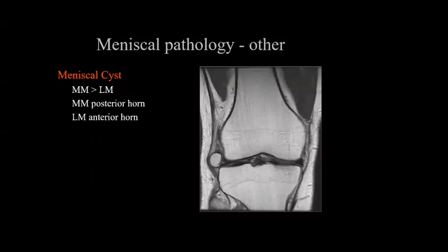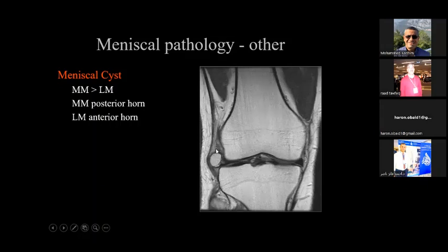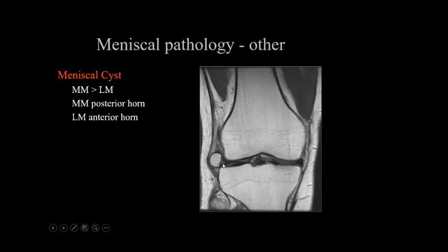The other thing we need to comment on, and I mentioned this when we talked about the hip MRI and the hip labral tears, is paralabral tears, and the same thing applies for the menisci. Sometimes you see parameniscal cysts, and it is important to describe them. Most knee surgery is done arthroscopically, and surgeons may not be able to see anything that lies extra-articular.